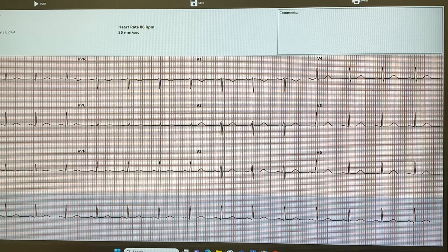So I call that the last name of the rhythm. We're giving the rhythm the last name already. Tachy or brady or normal. We would say it's normal, right? Because it's between 60 and 100. That's right. So then what do we do next? What do we look at next? We would look at the P wave if it's normal.